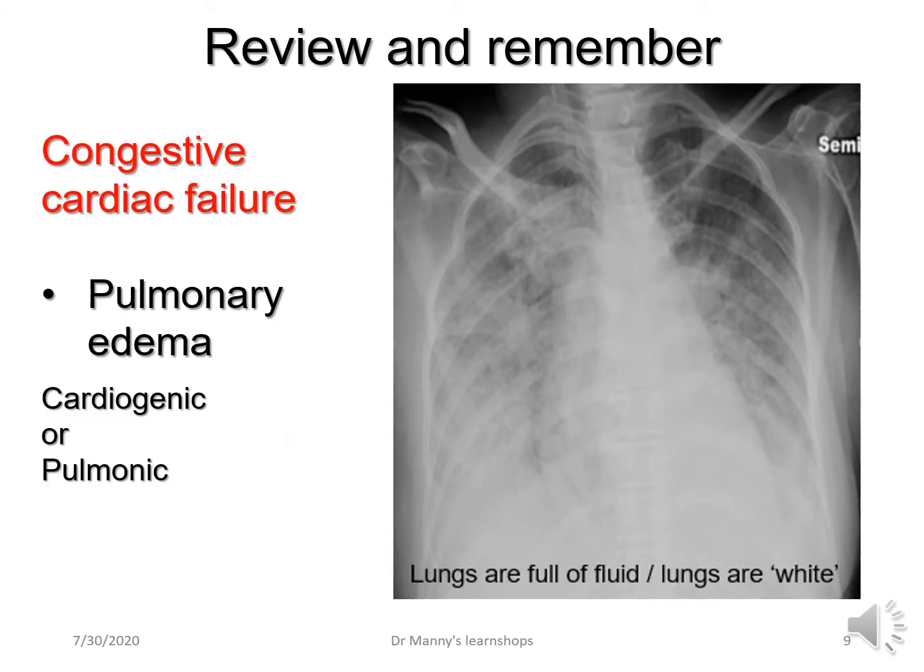This is an example of congestive heart failure. An example of pulmonary edema, which we've looked at previously. And in pulmonary edema, the lungs are full of fluid and the lungs are white. And this is as a consequence of cardiac failure.